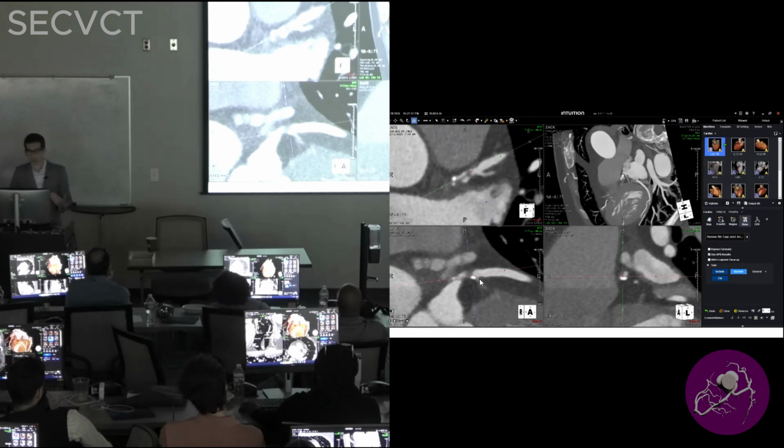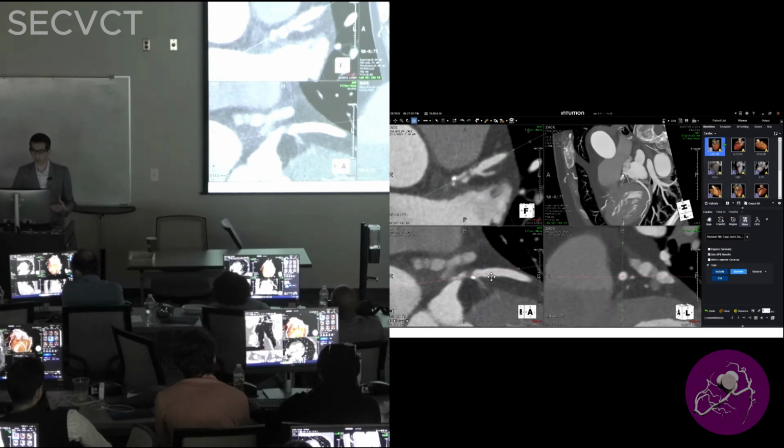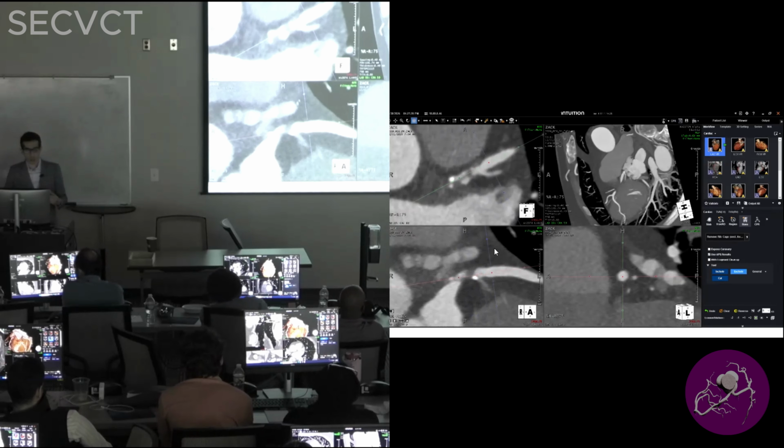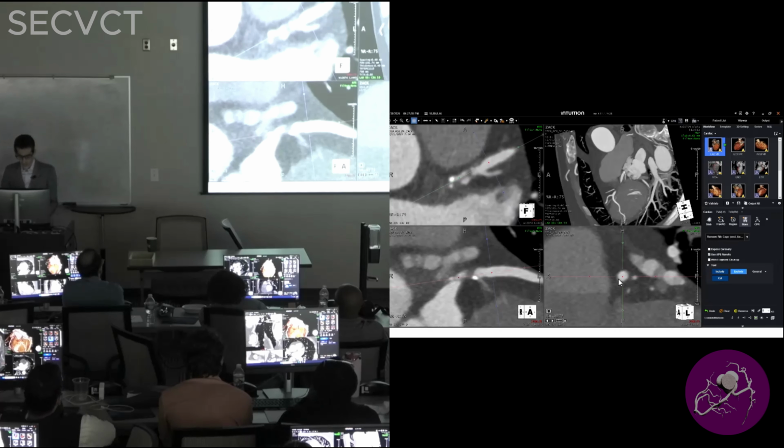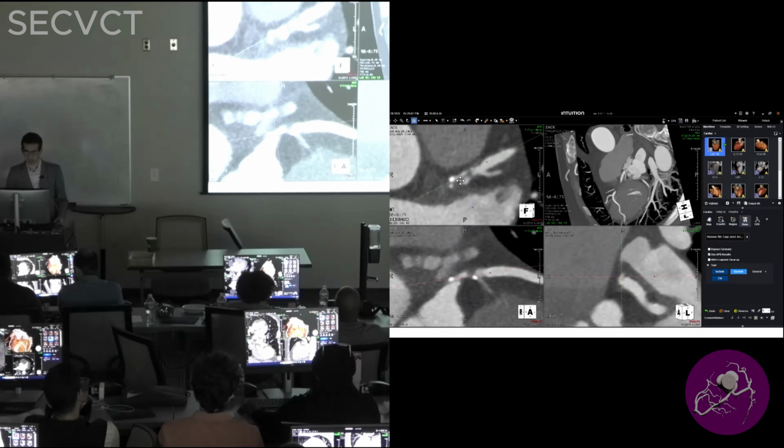And honestly, this is the time when you have a distal segment that is not too far and it's really healthy. So if we go here, carry your cursor, this is a relatively healthy segment. I can use it for my area. So from here, I'm just gonna fix this here. I'm getting an area of about 15 millimeters. So this is a large size LAD. This is a healthy segment. So now from here, I go back to the worst segment that I thought was really tight, and again, double oblique it and measure the area specifically there.